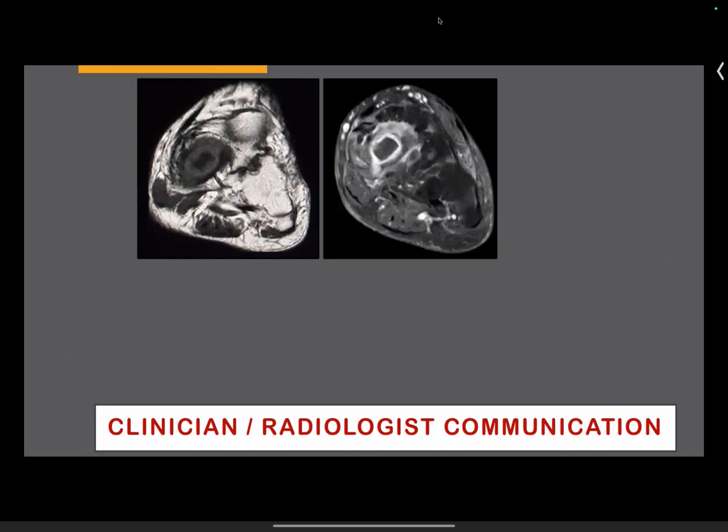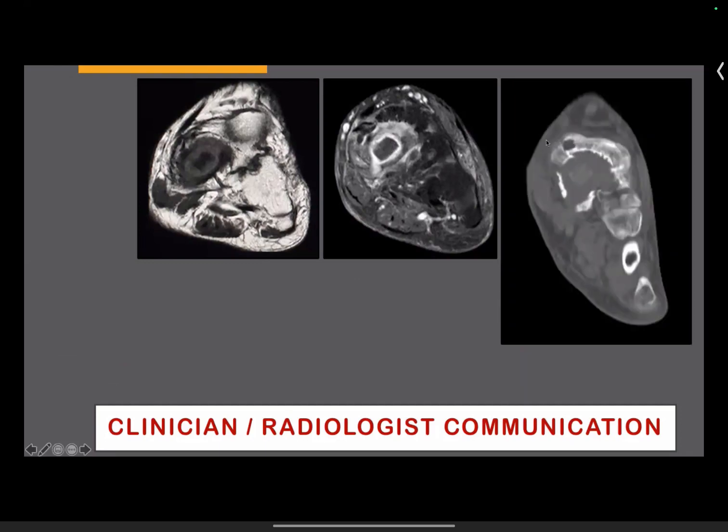Okay. We look at the post-contrast, you can see there is kind of enhancement around it, but that thing itself is not enhancing. It's probably dead bone. But when you do CT, it looks a bit dense, but it's not as dense as a sequestrum would be. Sequestrum are usually dead, sclerotic kind of dead bone. So it looks like something which is a bit dense, less dense than the bones. What is it? Well, we still call it acute chronic osteomyelitis with probably some dead material in it.